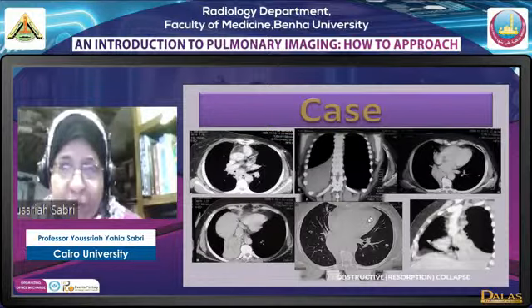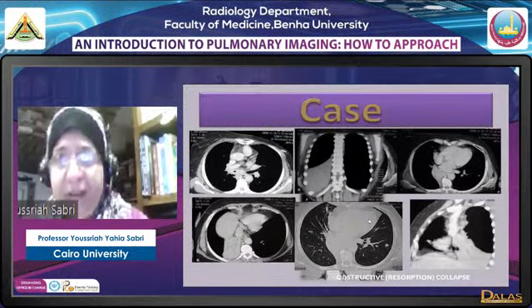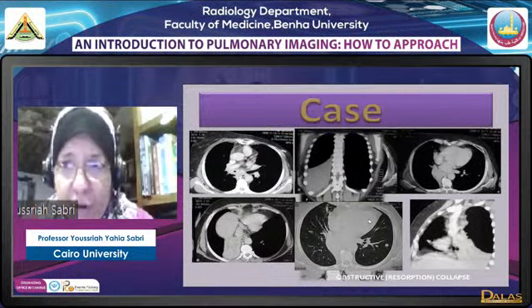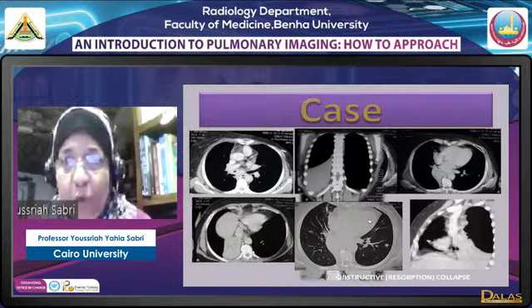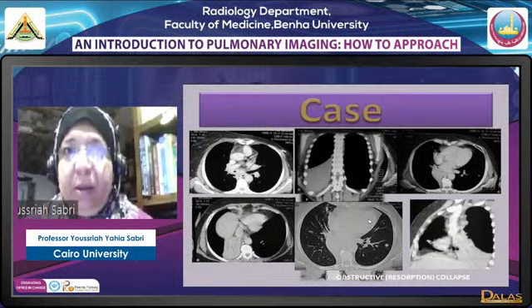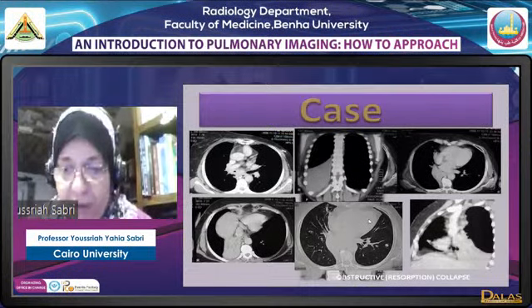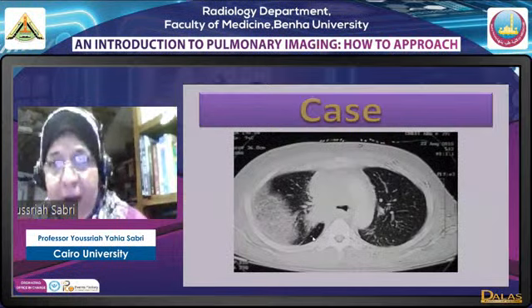Obstructive or resorptive collapse. So now we have seen cicatricial collapse, due to fibrosis, and it has a very significant, very special pattern. And we have seen the relaxation collapse, where there is massive pneumothorax, massive effusion, or something causing compression and relaxation of the lung. And we diagnose it by that the effusion is the hero, because we see shift of the mediastinum. Then the obstructive collapse or the resorptive collapse. Finally, we have the final type of collapse.